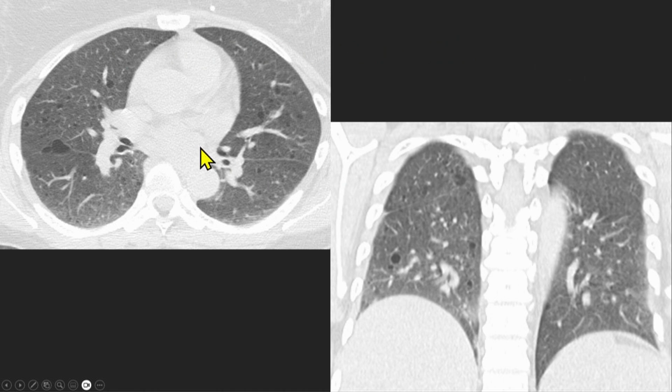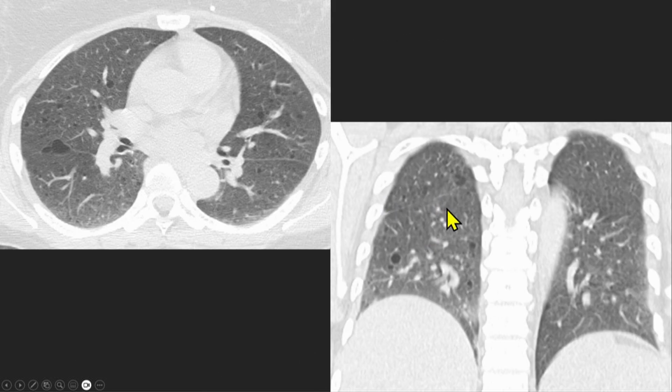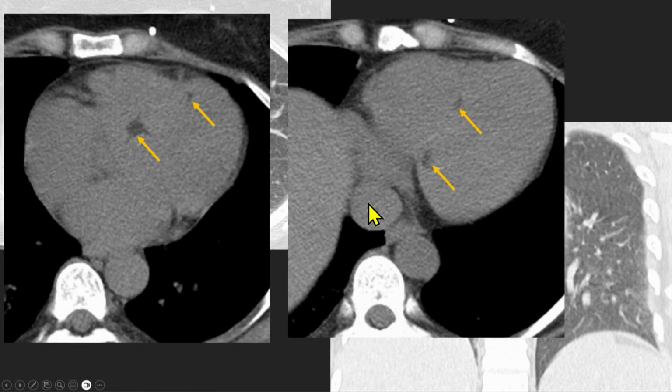Here's another patient. And so you're probably wondering, well, you showed these beautiful examples of cystic lung disease in LAM. Why are you showing now this not so great case? It's to remind me to tell you about the tuberous sclerosis component. So remember, a patient with tuberous sclerosis is going to have other concomitant findings. On chest CT, this is what I look for.